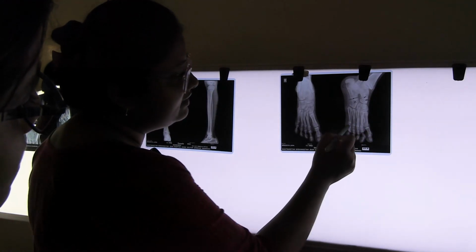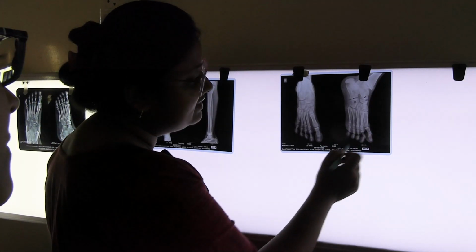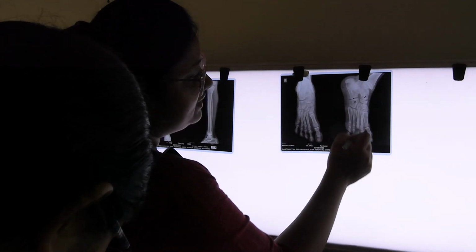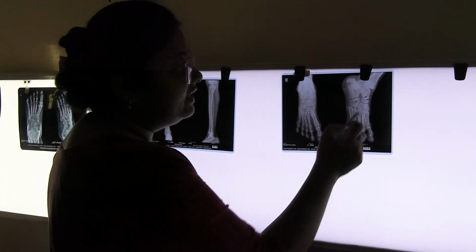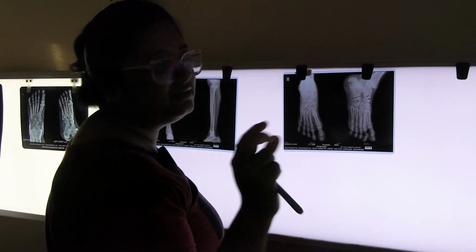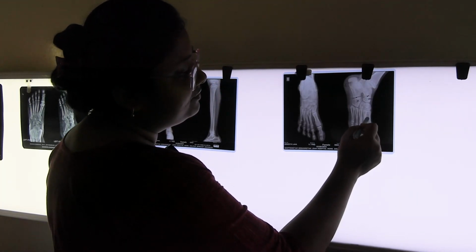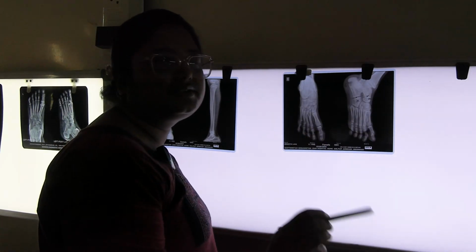Same, the epiphyseal line can be visible in this 11-year-old female patient. And for phalanges, epiphyses are lying near the base of the phalanx, and for the metatarsals, epiphyses are lying near the head of the metatarsal. And these tarsal bones are short bones. They are ossifying from a single center. Okay. And for the great toe, the metatarsal epiphysis is lying near the base of the first metatarsal.